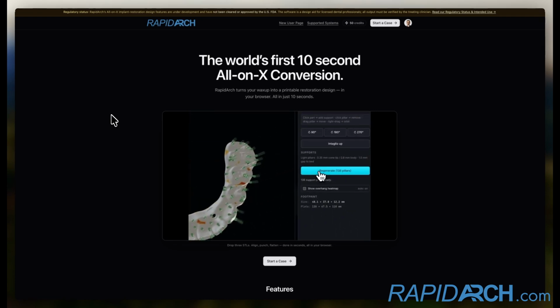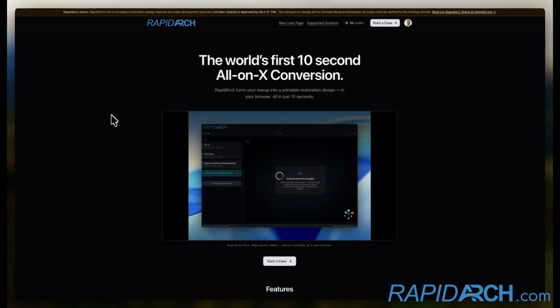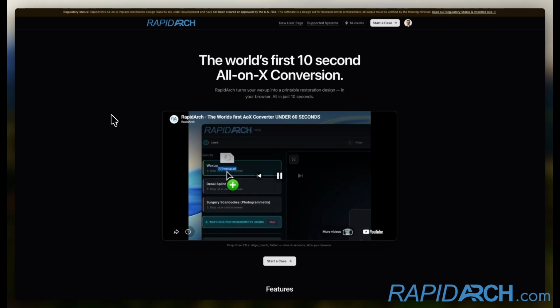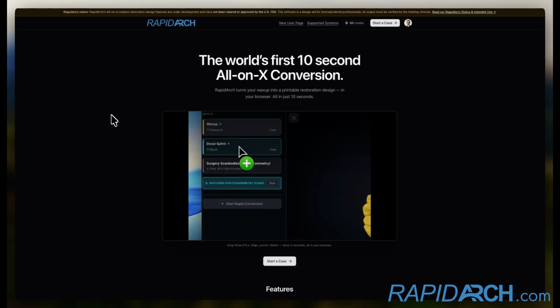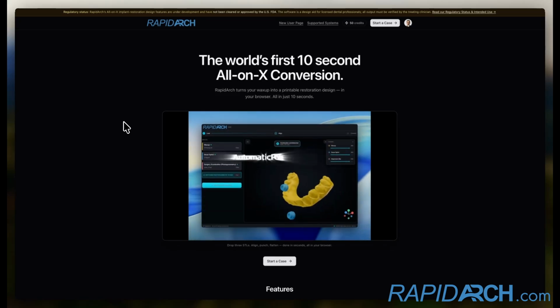So this was a case that was sent to us by one of the dentists that uses our software, and I noticed the way that the Waxup was done left a little bit to be desired. So I'll show you guys why that happened and what we can do to fix it within our software and what we can do to prevent it in the future.